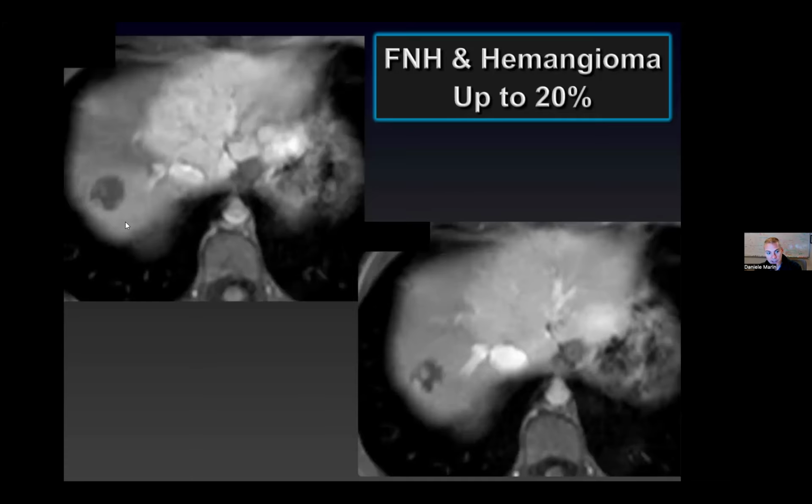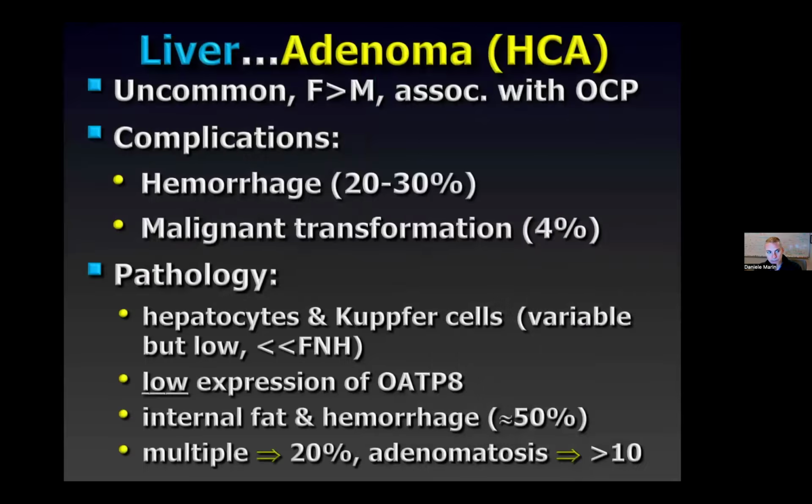On the arterial phase and on the portal venous phase, you can see the classic enhancement pattern of the hepatic hemangioma with peripheral nodular, discontinuous enhancement, and the typical enhancement pattern of the FNH with sustained arterial enhancement and fading to isointensity on the portal venous phase. Again, the dynamic enhancement pattern should basically enable a confident diagnosis.